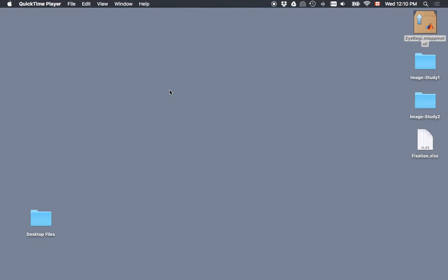Hello everyone. So here I'm going to show you a quick demo about how to use our software to analyze processing eye movement data. So first you'll see this installation file, and if you have MATLAB installed on your computer, I think the version should be newer than 2013B, and you should be able to just double click to install it.